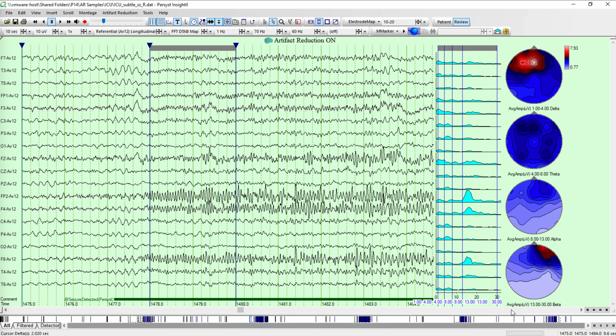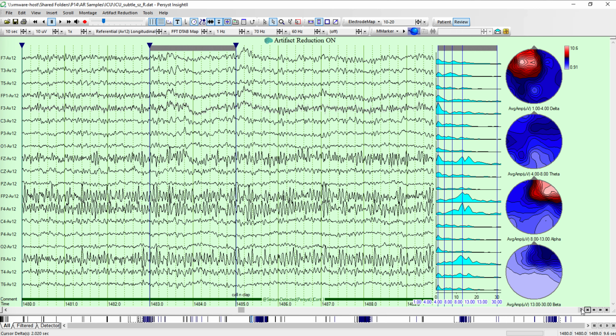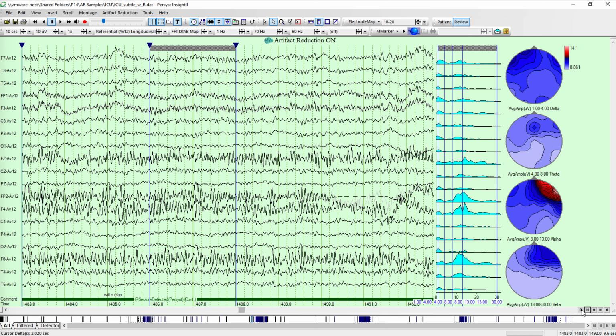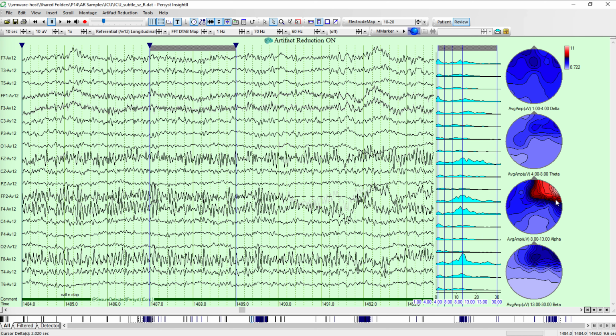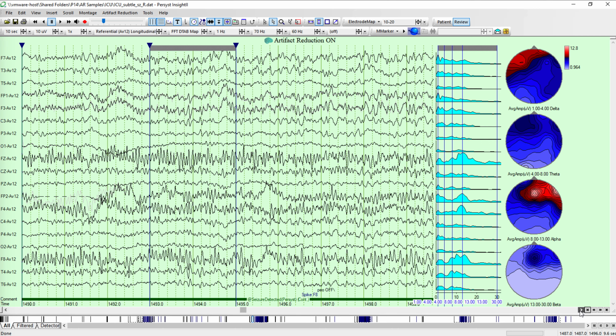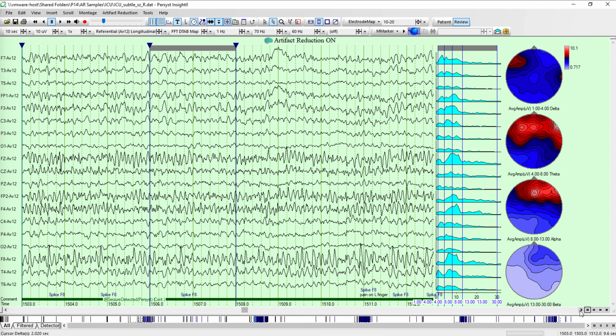And we can see the beta map is lit up at that point. Now, as we advance this just a second at a time, we'll see the beta fade out as the seizure begins to exhibit this evolution in frequency, where it's going from faster to slower. Now, the activity is concentrated in the alpha band. And just as a quick aside, we're looking down at the top of the head. That little triangle there is the nose. So we're looking down at the top. And as we go further here, we'll see that go from the alpha to the theta band maps.